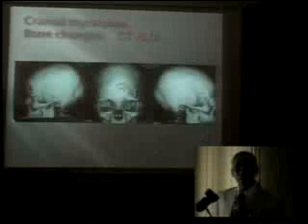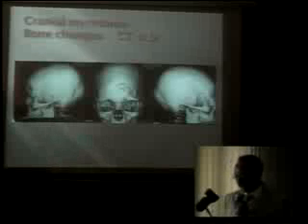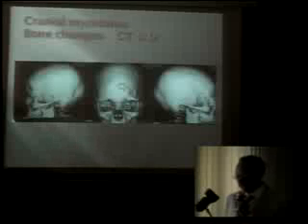Again, another very potent tool. I feel it is very important now in managing such patients, that is the three-dimensional CT scan. You can see the areas of infiltration. And that is how the pathology eroded the roof of the left orbit. Now we are looking at the left side, so that is the lesion.